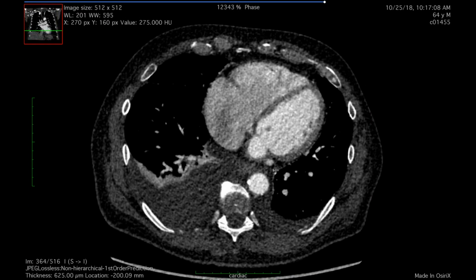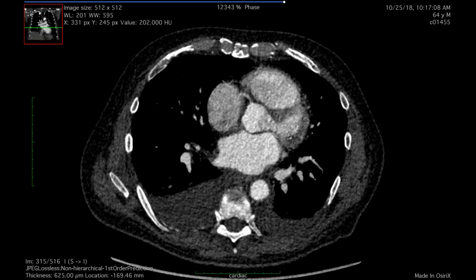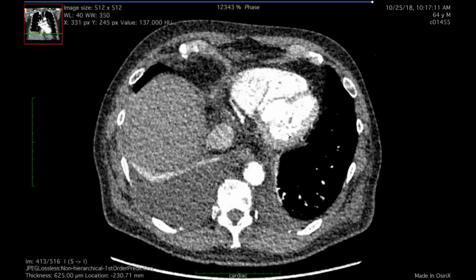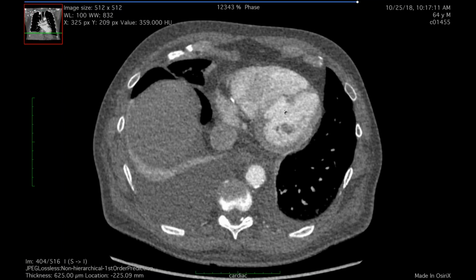But I think he still has the effusions. They've tuned him up a little. His RV is certainly still borderline enlarged. It kind of looks like shunt vascularity from this. But I don't know. We see maybe 1 or 2 of these here, and I know other people show them as well. But it's a good example of an acquired ventricular septal defect.